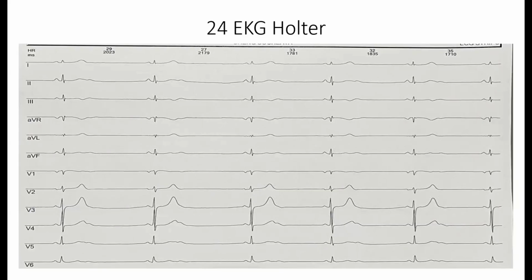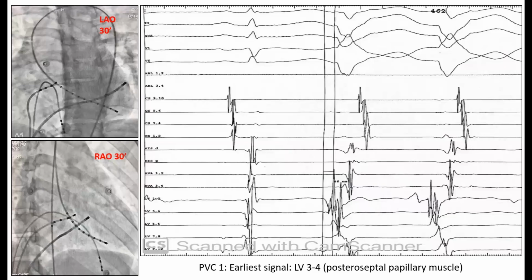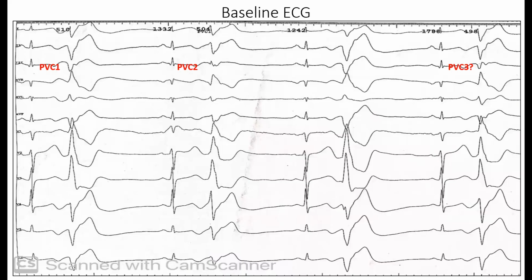We did the first approach of a biventricular approach, what we call. Oh, just go back to the EKG. Let me make a comment quickly on the tracing. Yeah, there we go. You talked about PVC 1 to 3. This is basically a difference in exit site of the same PVC, having a wide range of lead 3 changes because the inferior axis is more sensitive. But if you look at PVC1 and PVC2 and merge them together, they become PVC3. So this is basically a varying degree of axis variation, probably from a single area causing this.